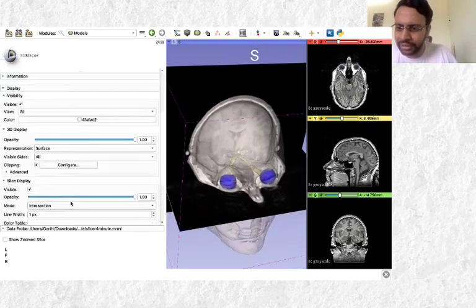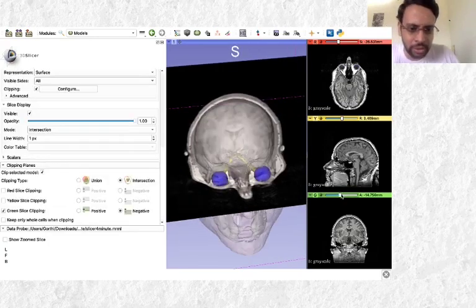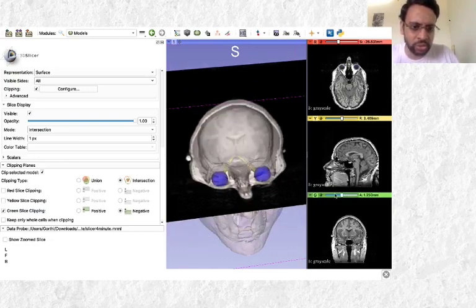So what I did for that is I went to the advanced features and I went to this green mode, because this is where I don't want the things. So green slice clipping, okay, and with the -1, and I am doing this part for white matter hemisphere. And now I can adjust where exactly I want to do this.